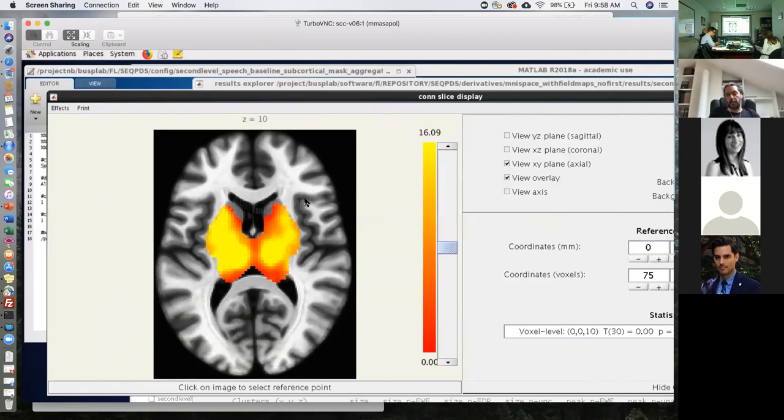And the thing that was happening is that for a few subjects, some of the voxels that in this template look like coded, they were just within the ventricles themselves, so they were masked out because they were identified as out of brain voxels. And then when the second level analysis came in, if it found a voxel that had been masked out for at least one subject, it removed those voxels from the analysis. So that was why we were getting all of this cropping at the borders, and the same thing happened in the cerebellum.